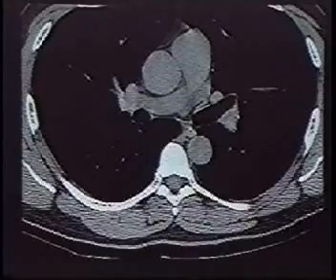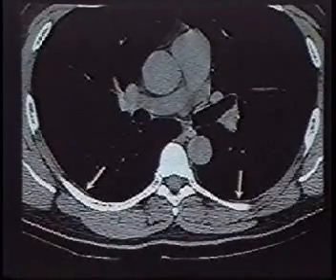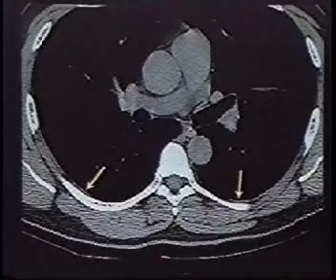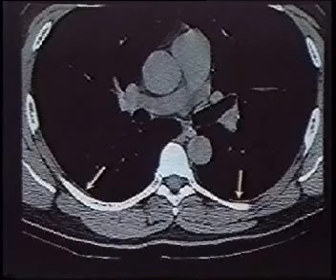And finally, in the posterior ribs, because it assumes a more parallel course to the X-ray beam, sometimes we can see the innermost intercostal muscle traveling over the tapered edges of the ribs to insert on the ribs, and therefore sometimes it can be visualized directly internal to the ribs, and therefore mimic pleural thickening.